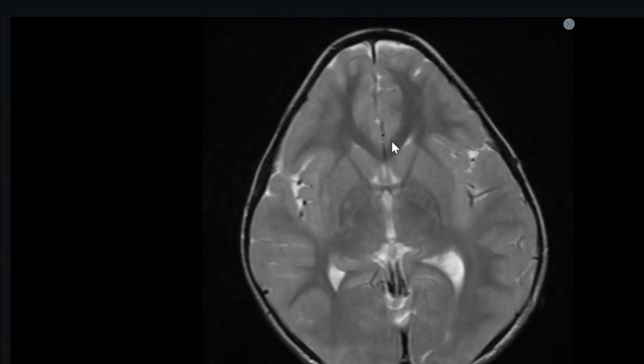No, it's not lemon. Sir, I will look for craniosynostosis. Is it a boat shaped skull? Craniosynostosis is what I'm concerned for. What is the name of the deformity? Sir, I don't know. It is due to coronal suture fusion. I forgot the name. Boat shape maybe, or I forgot the name.